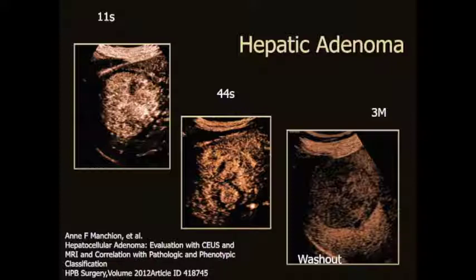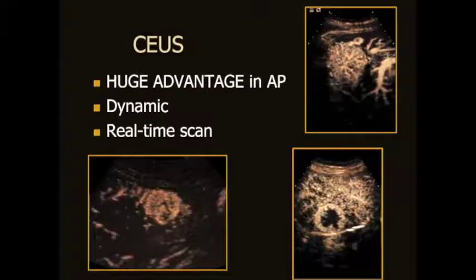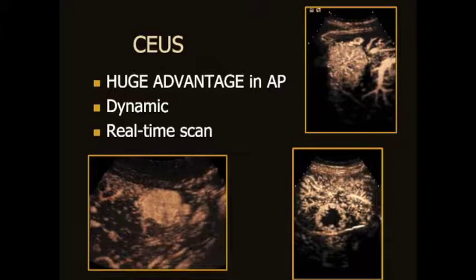So because of our rule about washout, recognizing even that this patient may be at risk for adenoma, we would recommend biopsy or referral for surgical consult. So let's just look at these beautiful pictures on 3 different patients showing benign tumors.